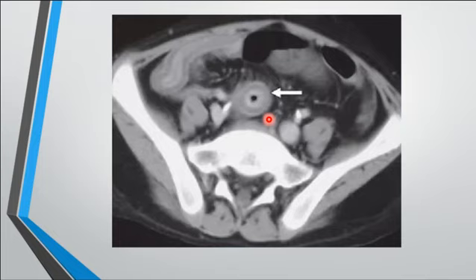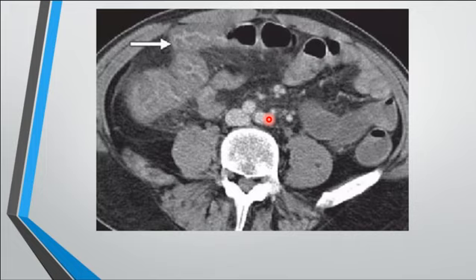Always keep it in mind. Any bowel wall thickening in the ascending colon, ask about history of immune problems, neutropenia, something like that. Okay, and ischemia, of course, it's a common cause. So, what about here? What's this sign?